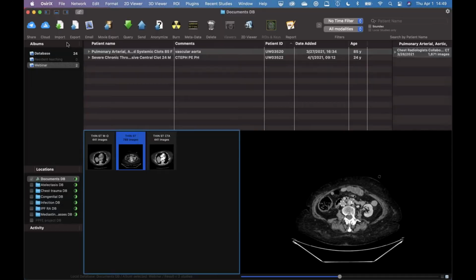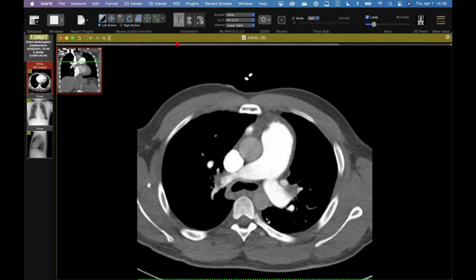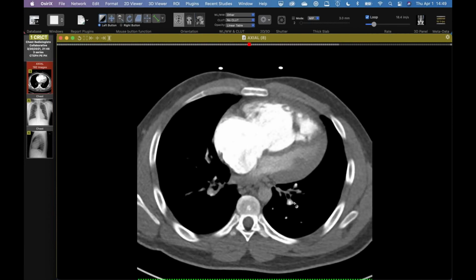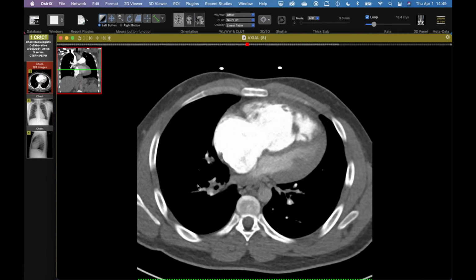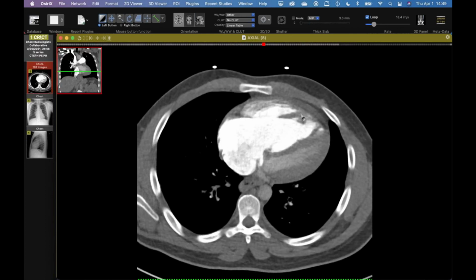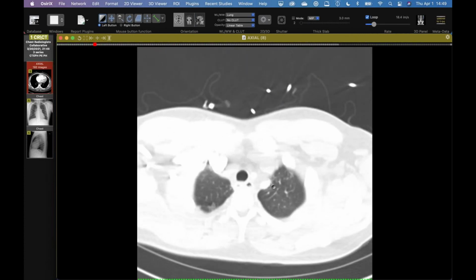You know, I was asked about that. I don't like it, and the reason why I don't like it for sarcoma, first of all, if you just had this, maybe, but it would not explain all of this circumferential thickening, and to have no mets in the lung with this extensive disease. And plus, this has clearly been here for some time. Look at the RV hypertrophy and all the remodeling and all the shunting here and this systemic pulmonary shunt.